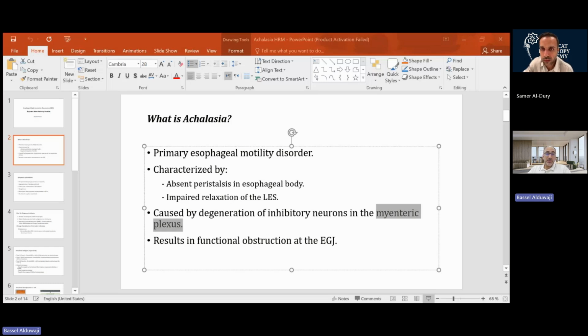But here we have to differentiate between achalasia type 1 and absent contractility, because if we just look at the peristalsis and there is none, it may be either. The criterion here is the IRP. If we have an elevated IRP, it's achalasia type 1. But if the IRP is normal and there is 100% failed peristalsis, then by this classification it's absent contractility.